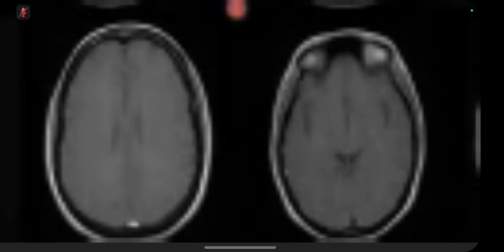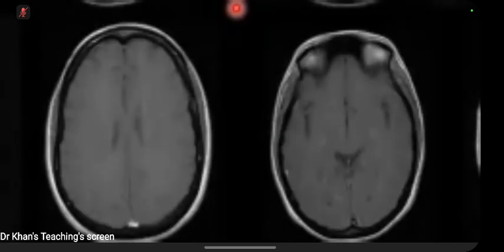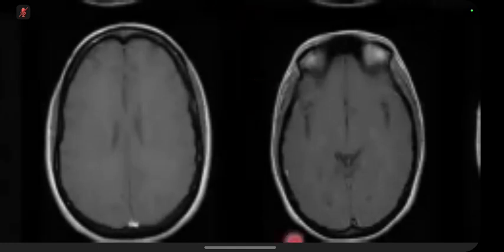So please remember, MS is a clinical diagnosis. They will tell you, we are worried about MS because of this symptom, that symptom. So you already know they are suspicious. And superadded to that, you get this kind of radiological features. And the bottom line is that by the revised 2017 criteria, you can diagnose it on the first scan, as in this case. Okay, thank you very much, candidate 1.